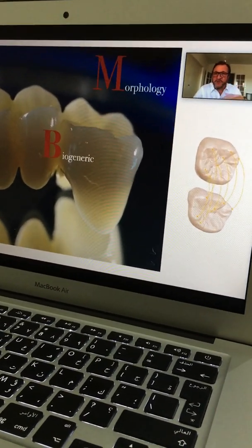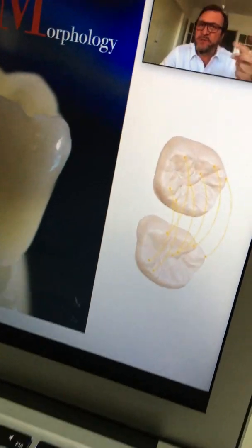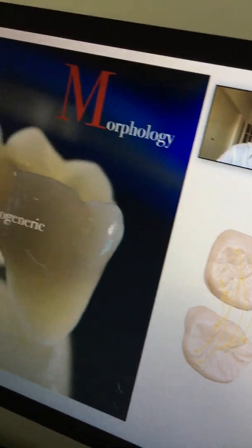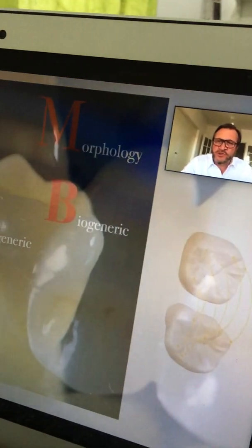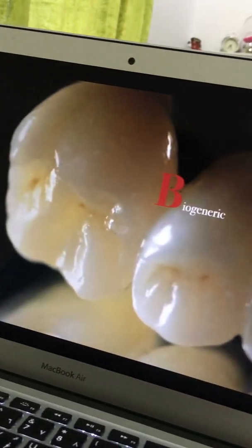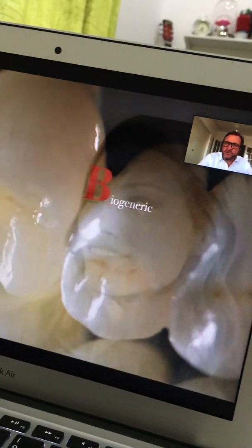And after, if I need, I can also use the database. So I have the two solutions inside the Inlab software. That's why I really prefer to use my Inlab software over another. And this is a solution, also no hands at all, only glaze on this zirconia, and I can have such a result. So not so bad.